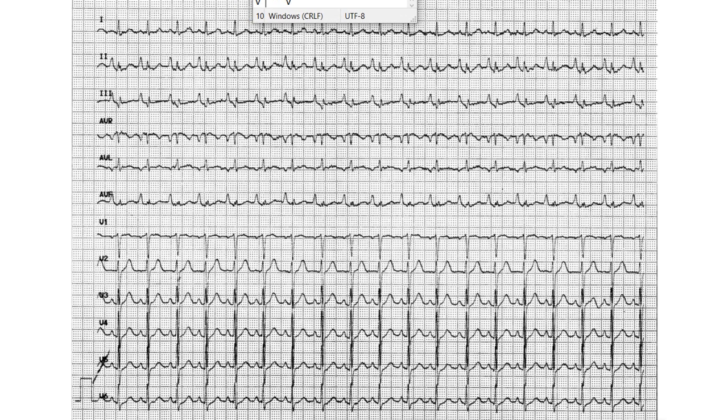Yeah, seems regular so far. Sliding paper technique. 1, 1, is good. Yeah, it's regular. So that's regular rhythm. And next point, is it sinus or non-sinus? Well, do we see P waves between everything?